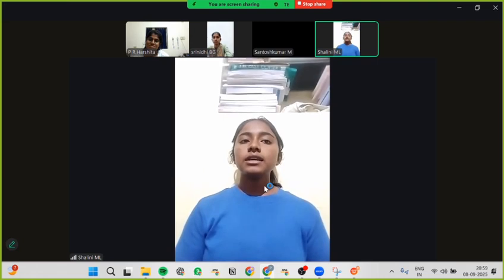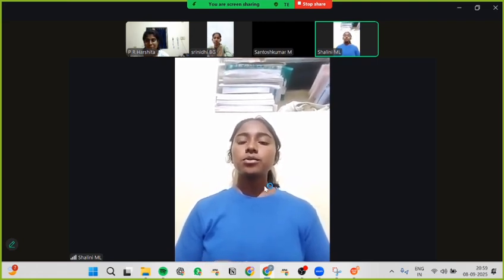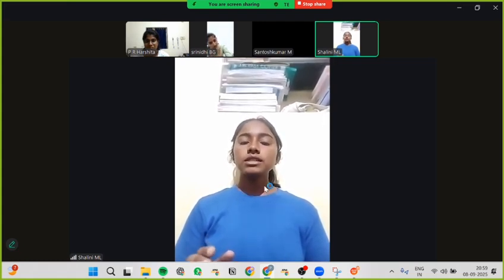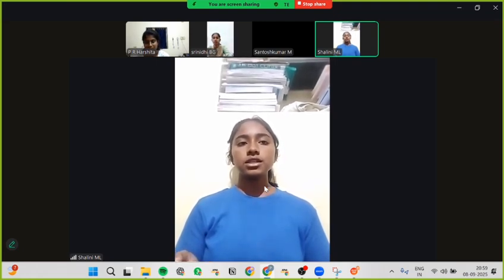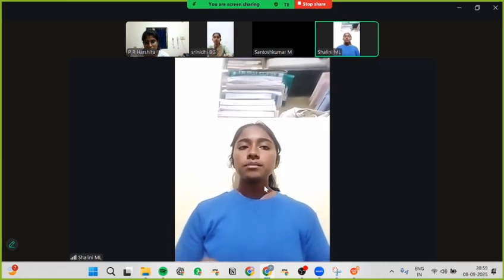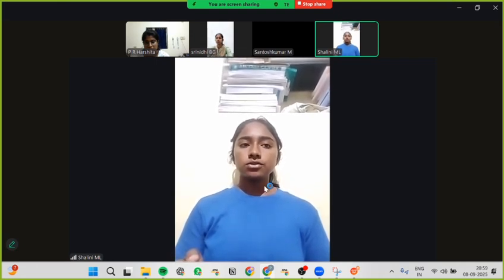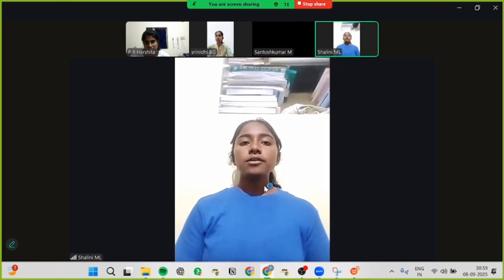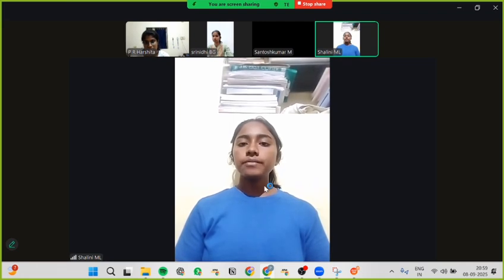In the input format, hospitals store images mostly in DICOM format, which is different from normal image files like JPG or PNG. DICOMs sometimes come with brightness or contrast issues or inverted colors. So we handle this using VOI LUT, which means value of interest lookup table.